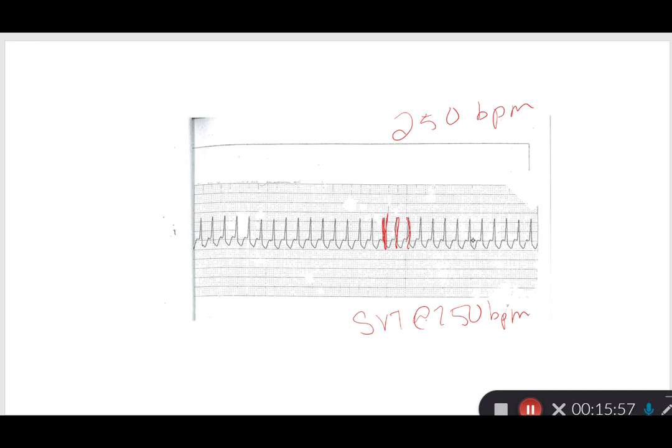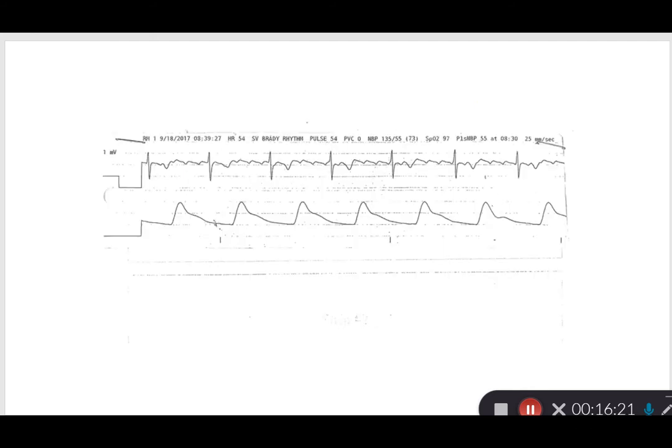Now I do have some ST depression here as well, so my QRS is actually going to end down here. You can kind of see that notch down here. So it's definitely below the isoelectric line. But again, it's going so fast. If you didn't pick up on the ST depression, it's not the end of the world. You are probably a little bit hypoxic in the heart just because of how fast that rate is going.